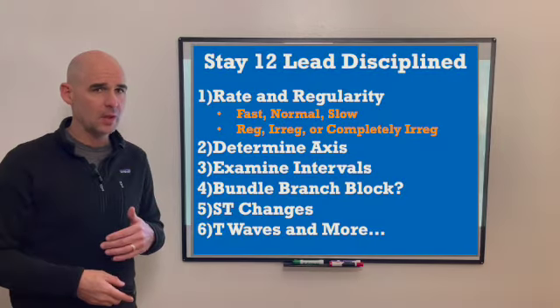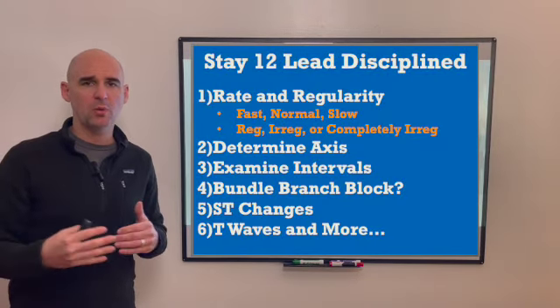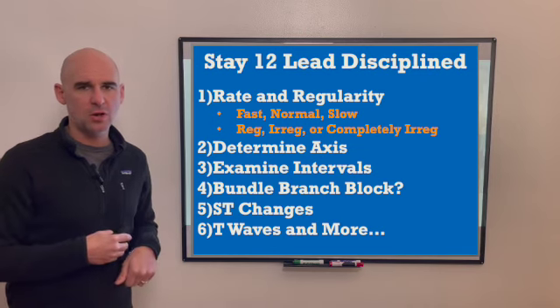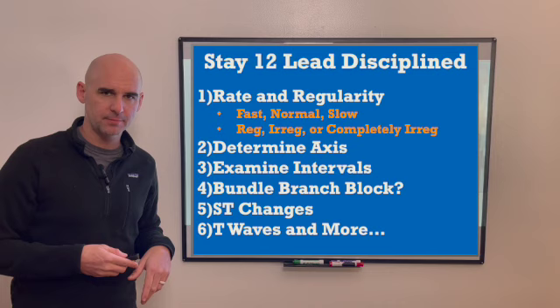Okay. So again, I think hopefully we're driving this home, why it's so important to have this disciplined approach. This is just step one, rate and regularity. We're looking, is it fast, normal, slow? Is it regular, irregular, or completely irregular?